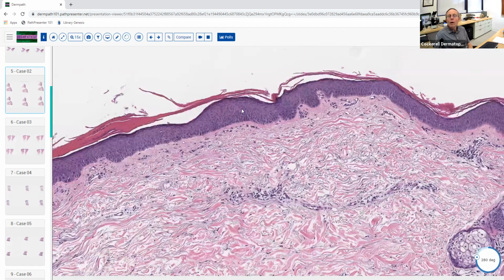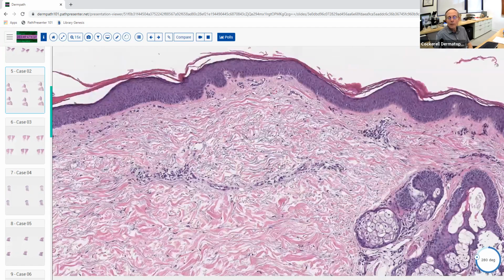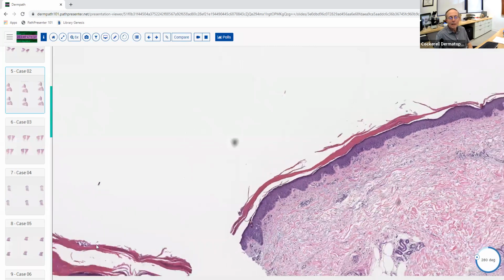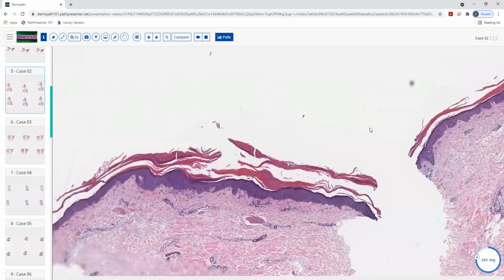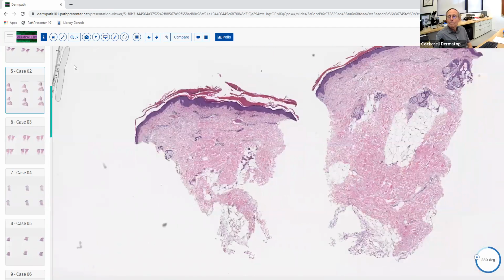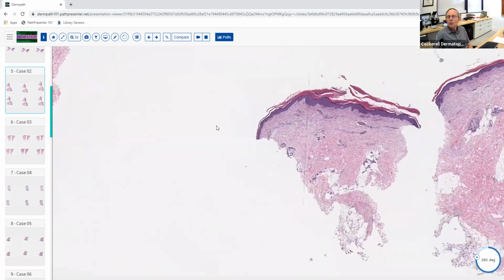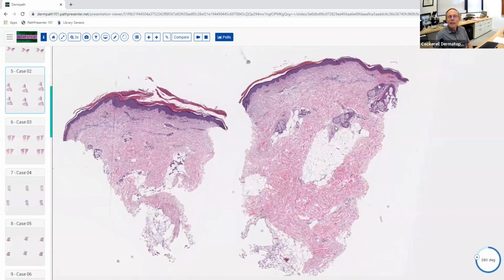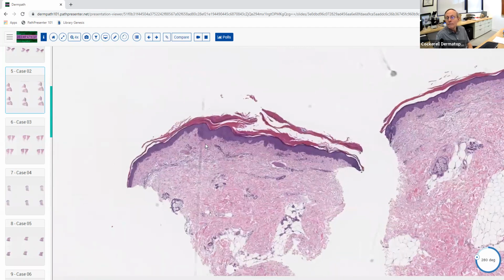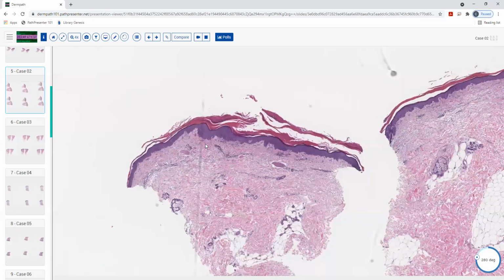There's one other thing they would probably show you on the board that we don't have on these slides here, which would be what? They might show some acantholysis. That's a more subtle, less well-known finding in PRP. But there's one thing that we do commonly see in PRP: follicular plugging and shoulder parakeratosis. Follicular plugging, that's the key.